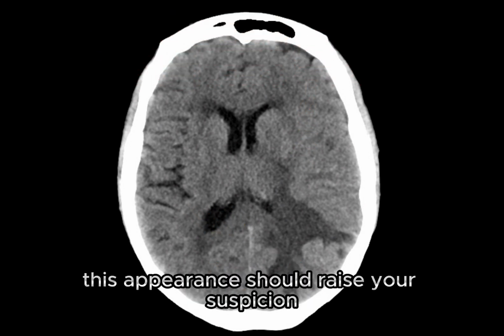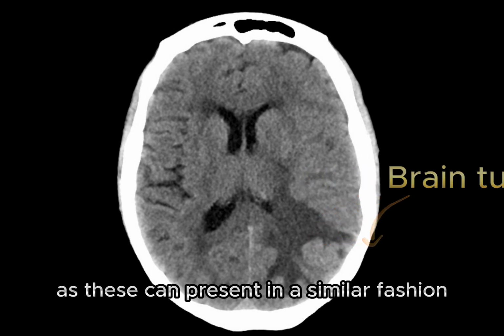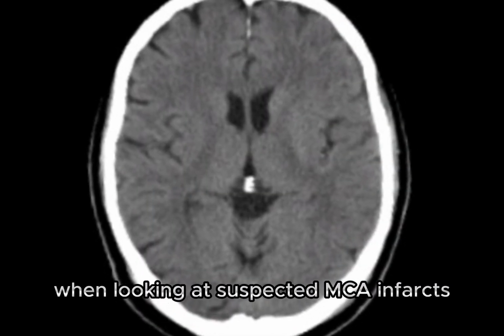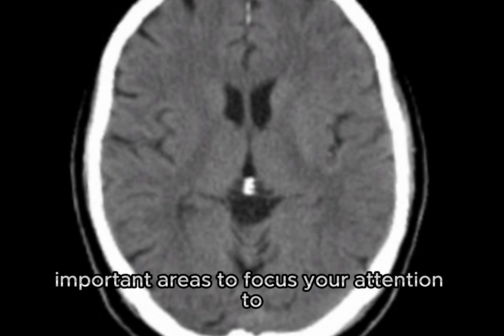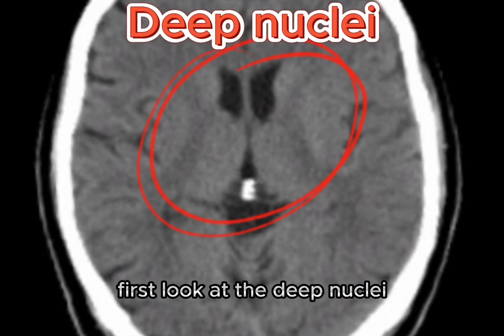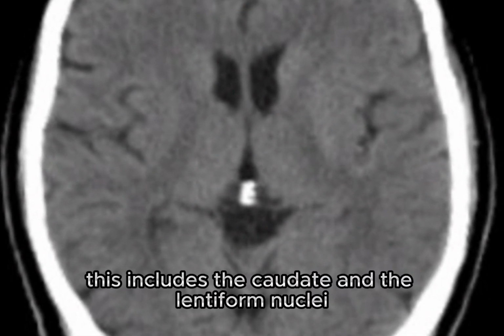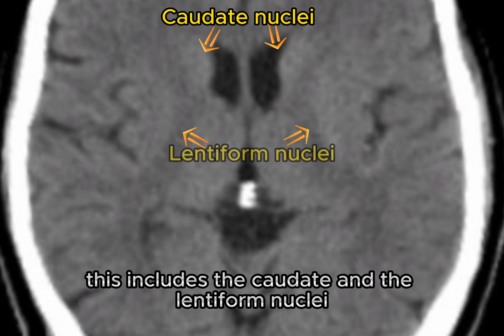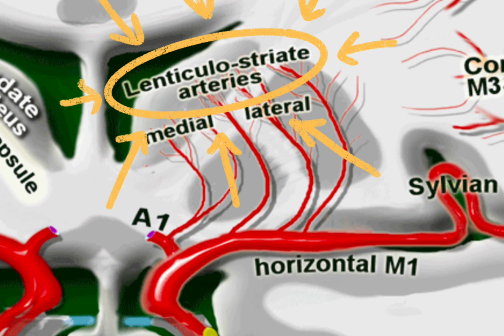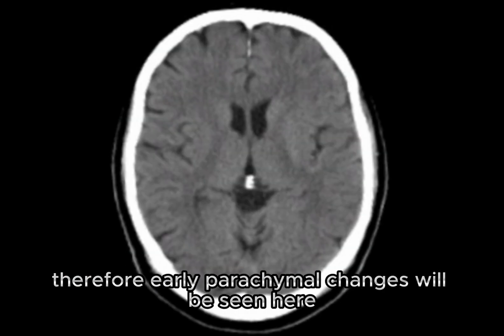This appearance should raise your suspicion of a brain tumor or an abscess, as these can present in a similar fashion as ischemic stroke. When looking at suspected MCA infarcts, there are two important areas to focus your attention to. First, look at the deep nuclei of the brain and compare them to the contralateral side. This includes the caudate and the lentiform nuclei. These structures are supplied by the lenticular striate arteries, which are end arteries. Therefore, early parenchymal changes will be seen here.